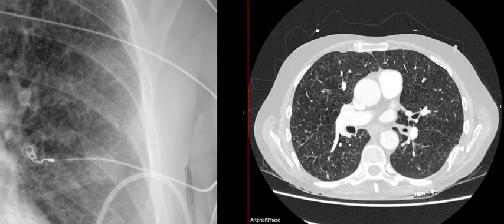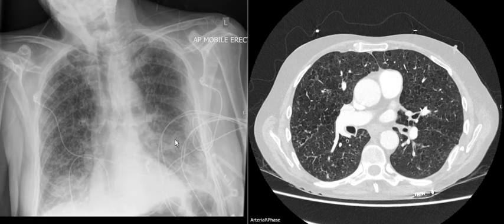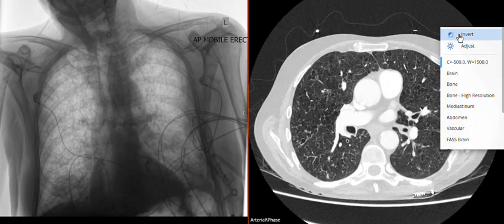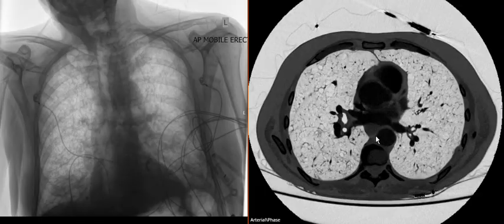And then let's just bring up a more recent X-ray. So he had some other issues and unwellness, and you can see this now. Increased opacity, lower zones, his left more so than his right. And he had a few incidents between then and now that led to him coming to the ICU. But yeah, this is what emphysema looks like on CT, and then what to look for in terms of the walls and voids on X-ray, inverting the grayscale, and the idea of how that looks, of this weird foam when you invert the grayscale on the CT.